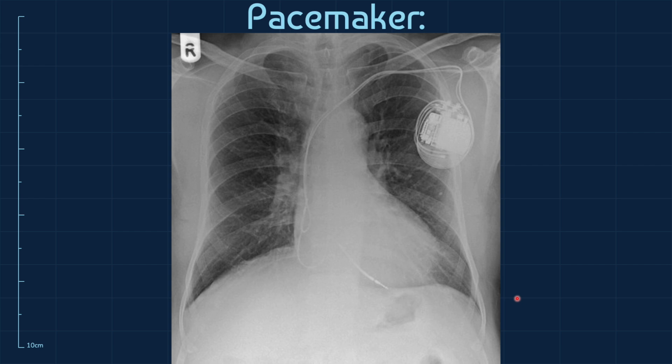It's important to note that you see them during an exam situation, or even when presenting this case to your attending or examiner. Always mention the things you see in front of you. That's how you get the points. That's how they know that you're going through it. But make sure you go through it systematically. Go through everything systematically, and this is part of the end of the systematic approach.